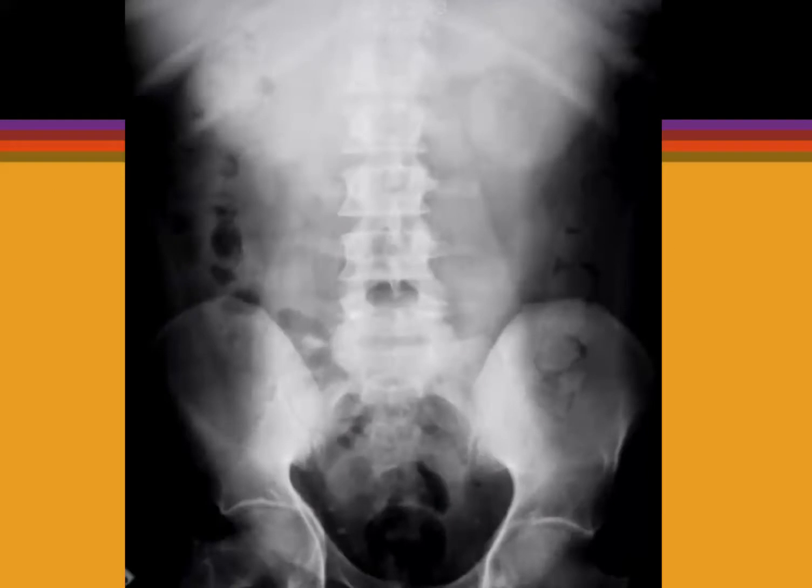So here is an abdominal X-ray. You can see probably most starkly the bones. You've got your pelvic bones, you've got your lumbar vertebrae, transverse processes. You can see the tops of the heads of the femurs, and you can see gas, which is translucent.